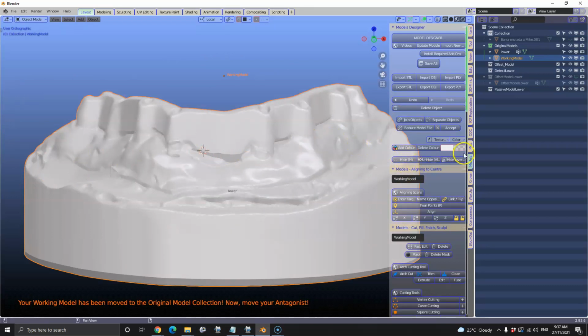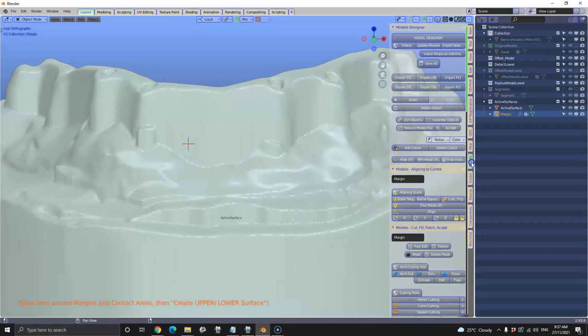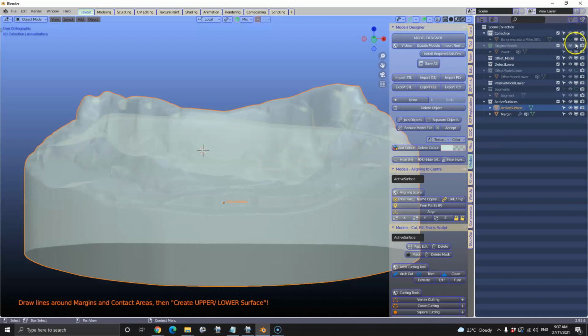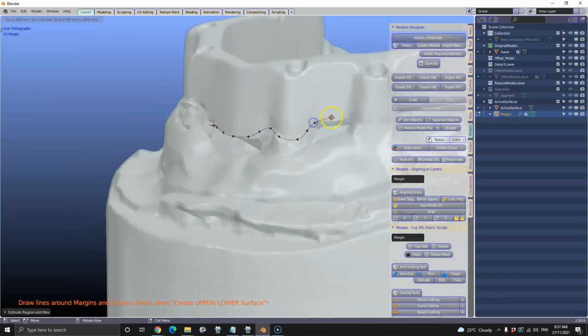We're going to then make a surface drawing. Okay. Oh, okay. This one we need to make more transparent. So let's just get out of it, select it, and I'll put it 0.5. But we need to see the original model underneath, like that. Okay, tab. You see now we've got a visual appearance of where, because I can see how you cut it. You cut it very different from mine.